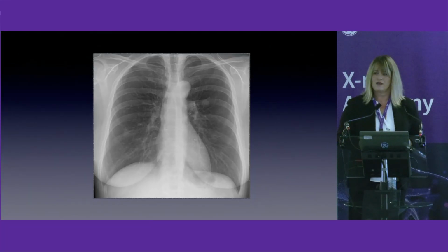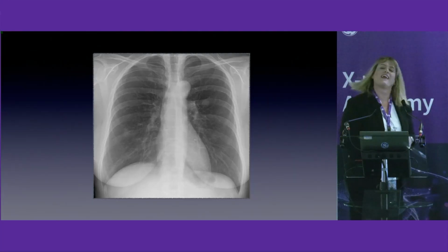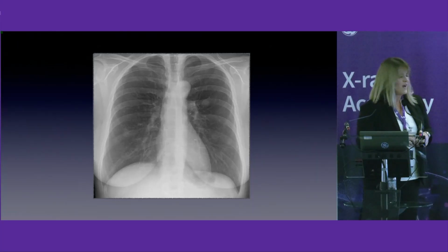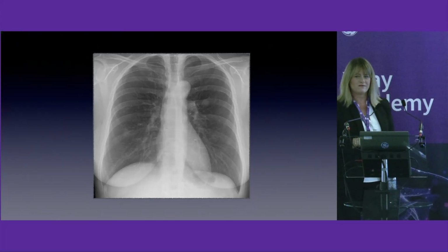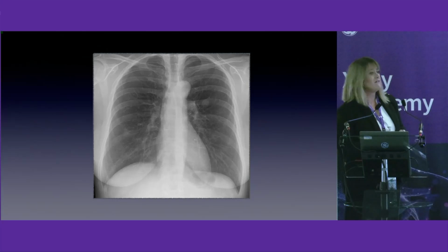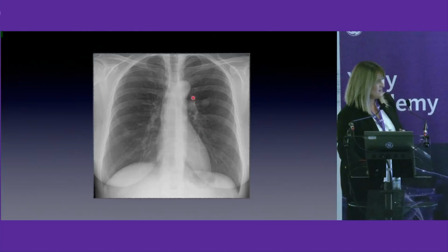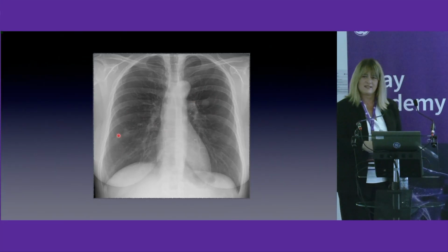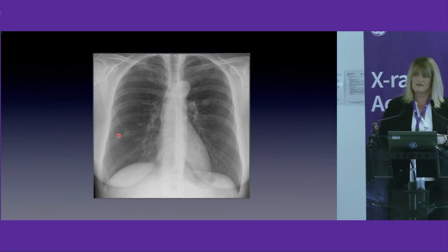And what about this? It's quite similar to the other one. Anything pathological? Again, nodules. Yes, I love nodules. So, 1, 2, 3 more. One on the right side, one on the left one. Yes, you mean this one and this one. Can you tell me something else or something more specific about these nodules?